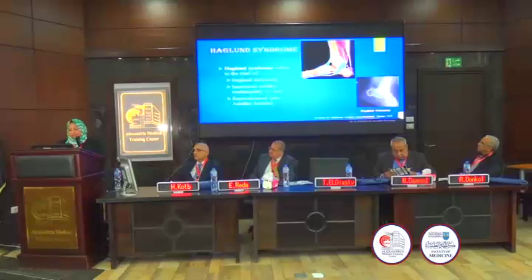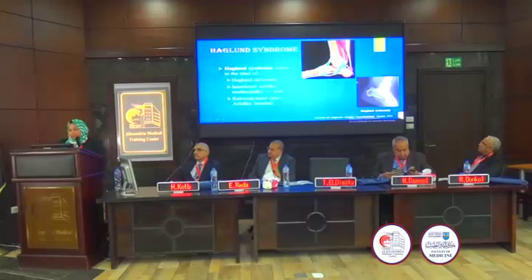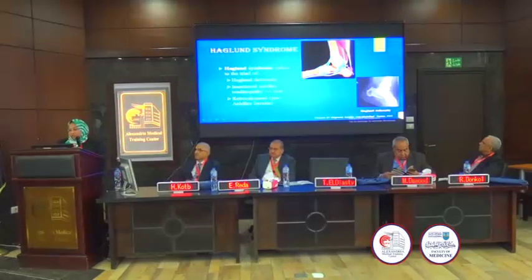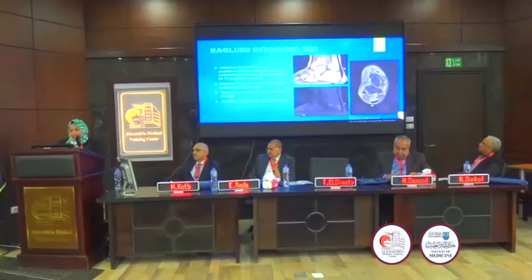Now I will go rapidly through the imaging appearance of some common hindfoot and midfoot disorders. I will start with one of the commonest, Haglund syndrome, which refers to the triad of Haglund deformity, which refers to the prominent posterosuperior aspect of the calcaneus, and insertional Achilles tendinitis, plus or minus tear, and retrocalcaneal bursitis. MRI, of course, will be excellent in delineation of the triad of this abnormality by demonstrating the deformity first.